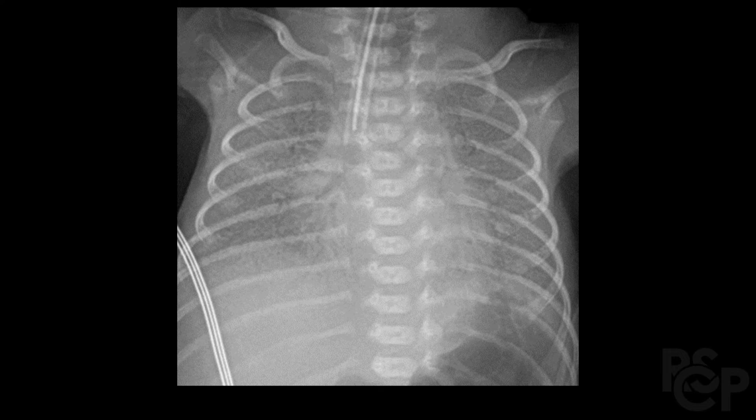Okay, this is another example, and this patient is similarly a premature patient presenting with respiratory distress. So we start off by identifying the lung volumes, which we notice are quite small, similar to what we saw in the last one. We don't notice any signs of pneumothorax, which would show hyperlucency on the edges. We don't see that anywhere. It's very diffuse, kind of hard to see. So there's hazy bilateral pulmonary opacities, and we don't see any pleural effusion anywhere, which we would notice at the bottom next to the costophrenic angles. We don't see that anywhere.